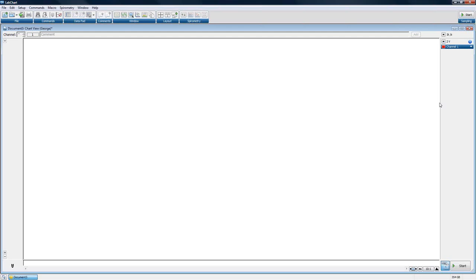Normally what you want to do is connect your spirometer to the PowerLab, turn on the PowerLab, start the software, and just let everything sit there and run for about 15 minutes, not collecting data, just sitting there with power applied. The reason for this is most electrical equipment is designed to be run at its operating temperature.